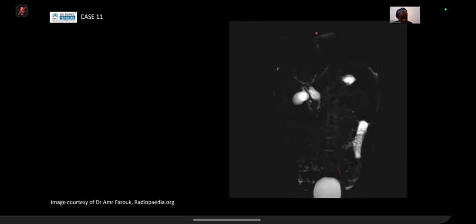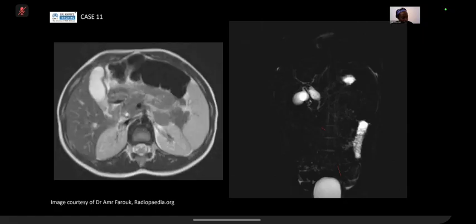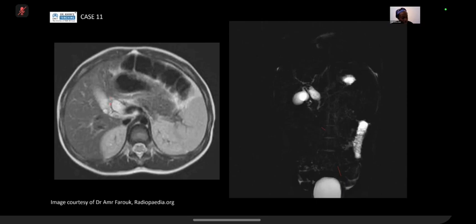This image, we're moving on, shows an MRCP study, which shows a choledochal cyst. So this is a dilated CBD, and this is your gallbladder, and this is your cystic duct, and this is abnormally dilated. So in a pediatric patient, I normally have up to 2 millimeters as my cutoff for normal caliber CBD. I allow up to 3 in the teenage children, but about 2 is my cutoff for normal CBD. And you can see here, this is just further MR images to show. So this is the gallbladder here, and then this is that dilated common bile duct.